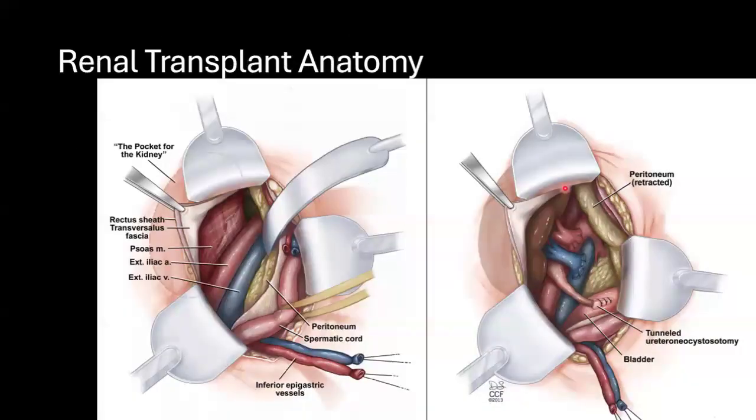As you know, in the renal transplant, anatomically, after they open up, usually they prefer the right iliac fossa region. After they open up the superficial structures, usually the transplant itself is placed in an extraperitoneal location, as you can see here. And you can have various types of renal artery and renal venous anastomosis, the commonest being an end-to-side anastomosis.